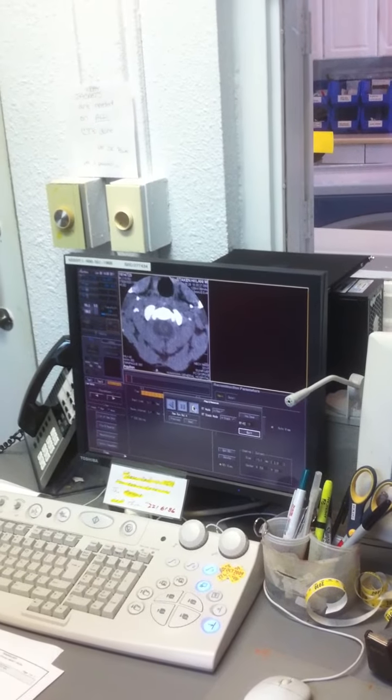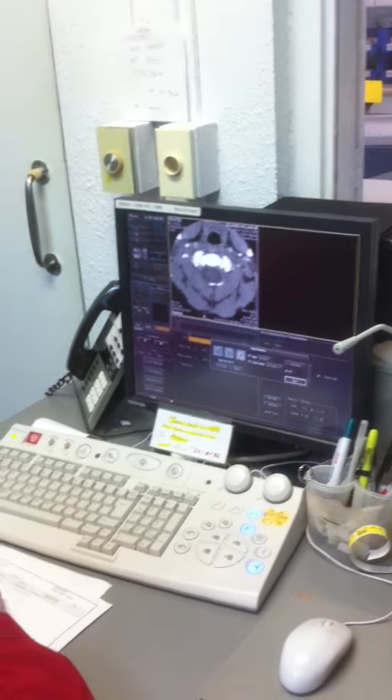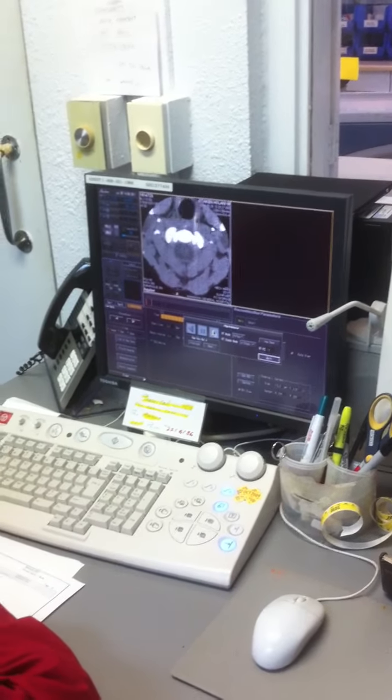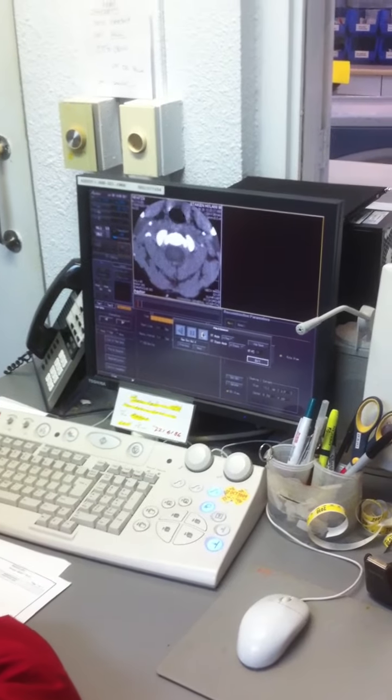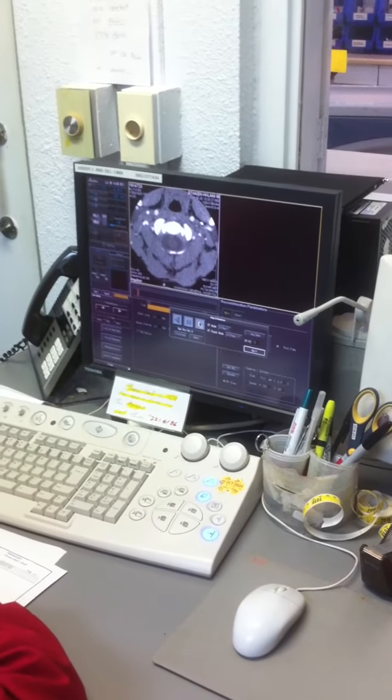Hey, Luke's on it earlier. Yeah, Ray, Gary wanted to find out if there's a way to put this on top of his PACS system, or save this so that for anybody new, we could always show them this is where to start for a carotid.